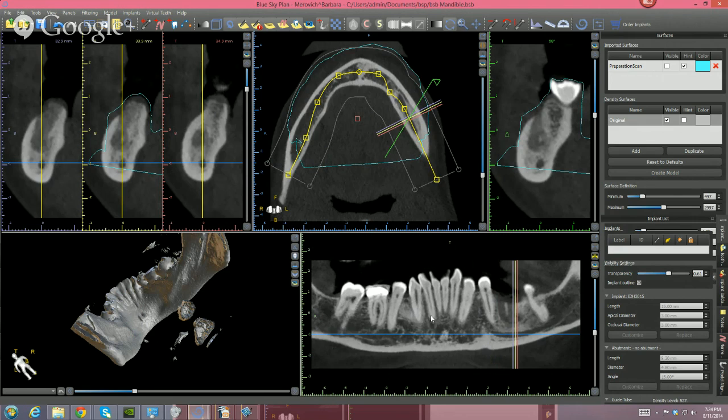But sometimes, and I don't have an example here, the mandible is not dense. It's not so radiopaque because maybe the patient has osteoporosis, or maybe they don't have osteoporosis. They just don't have a lot of dense bone, and they have a lot of cancellous bone that's kind of fatty and porous. Then you basically can't make out the mandibular canal. Sometimes you can't make out the mandibular canal in a periapical.